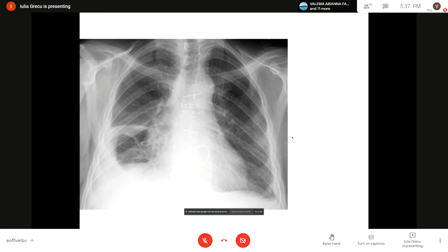And let's try something. When we look at the film, we discussed in the previous workshop that we have to first determine if that examination was performed correctly. So start with this. Is this a correct anterior chest X-ray? And if not, why? Let's see. I don't know. I'm not very good at this. We are not, because it's the second workshop, so we're trying.